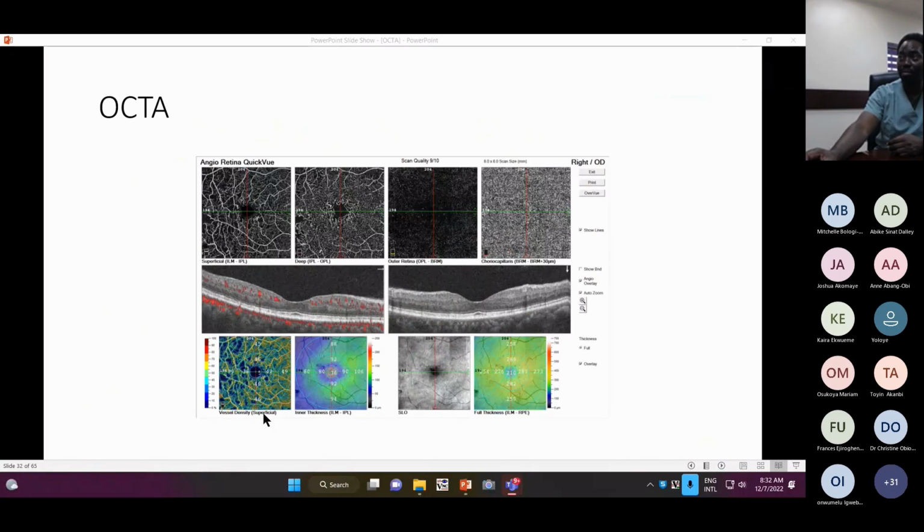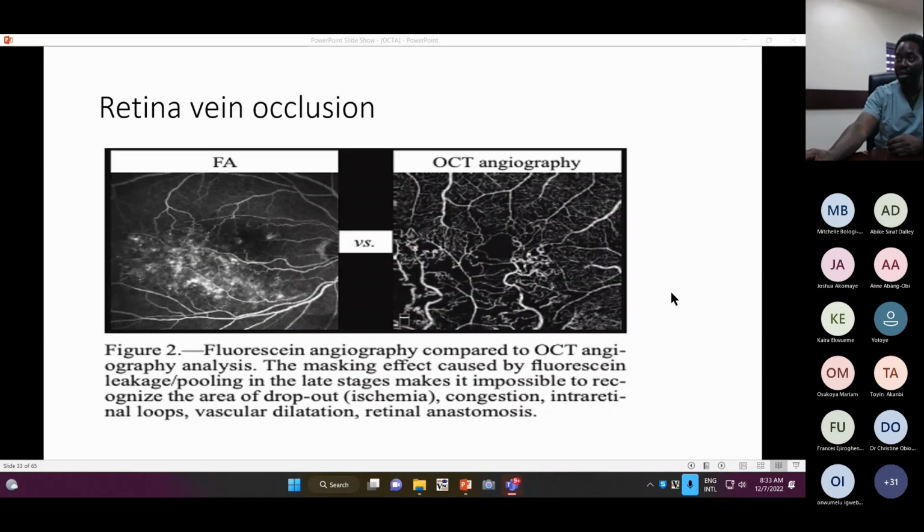Yeah, so this is one of our patients. You can see diabetic, non-proliferative, but you can actually see that it's beginning to have an enlargement in the foveal avascular zone for both the superficial and the deep. It still has good vessel perfusion, but this is a patient we watch out for. Look at the vessel density, FAZ, vessel density, and you can see these capillary dropouts here much earlier before the patient even begins to complain too much.